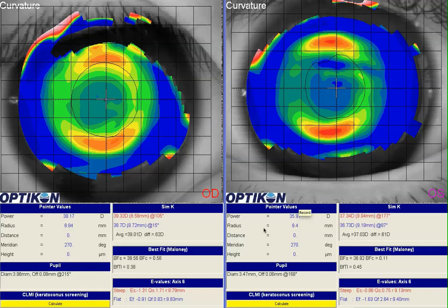This is an orthokeratology case where the patient is young, 8 years old, and is new to contact lenses. The posterior topography shows a little bit of lack of definition in the return zone, especially in the left eye, and the patient's also a little bit undercorrected, about a diopter and a quarter to diopter and a half residual myopia. And if we bring up the lenses, we'll see.